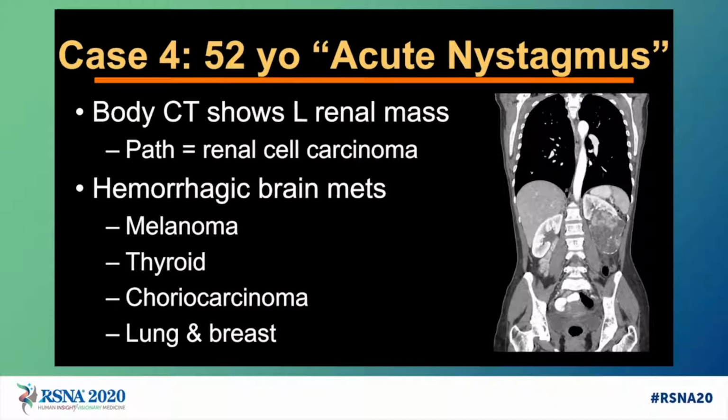Well, our findings launched further imaging, including a body CT. And here you can see that the patient has a nasty-looking left renal mass, which at pathology turned out to be a renal cell carcinoma.